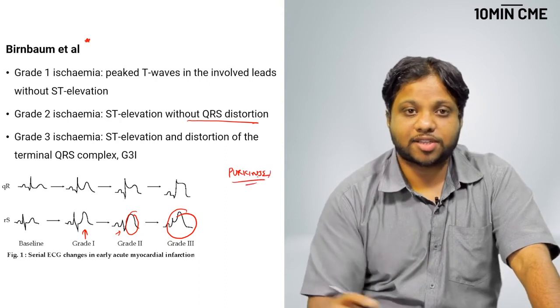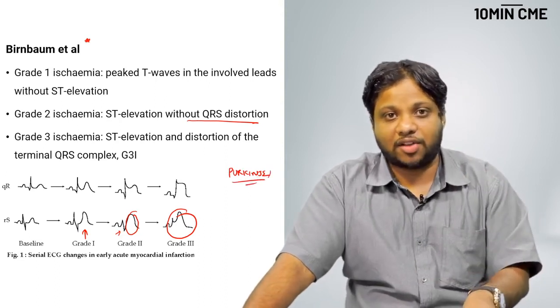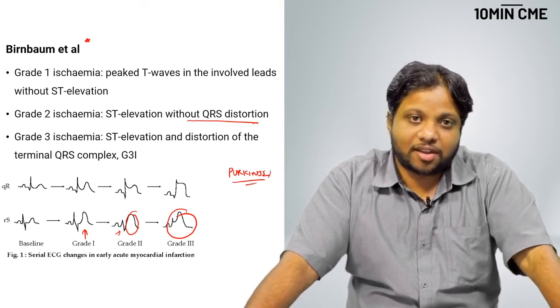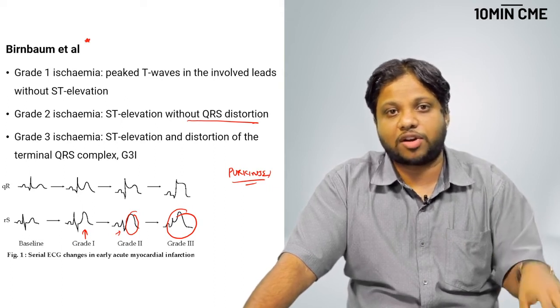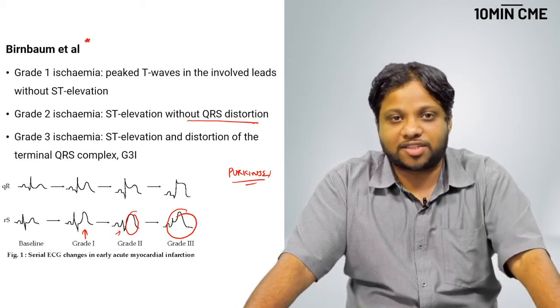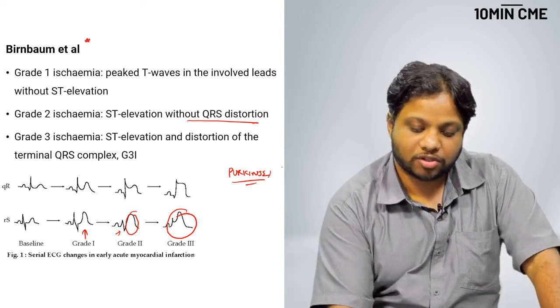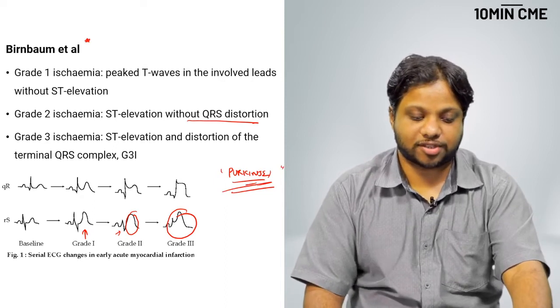Now, your Purkinje fibers are the most resistant area to ischemia. So, involvement of that signifies marked ischemia. The patient obviously is going to be sicker, and what is more important is this patient might not have a very good response to primary PCI or thrombolytics. This is the case where you expect a higher degree of complications. This is the case where you prepare the family for an adverse outcome. So, again, grade 3 ischemia indicates Purkinje fiber involvement, a bad prognosis.